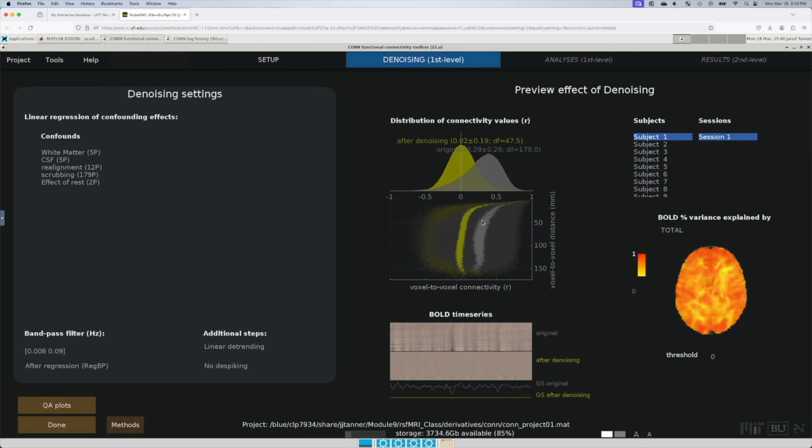And then the other thing we can look at is down here, where there's some banding. It should be pretty smooth, fairly homogeneous afterward, and this global signal should be pretty flat afterward. A little bit subjective. There are other ways to turn this into a metric and be more formal about it, but that's just a visual check.